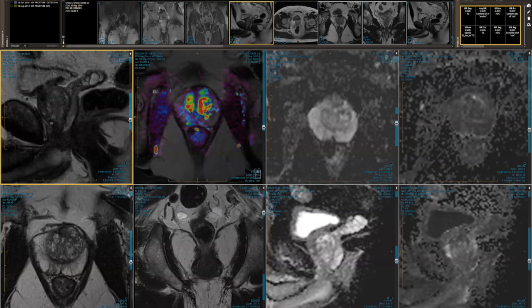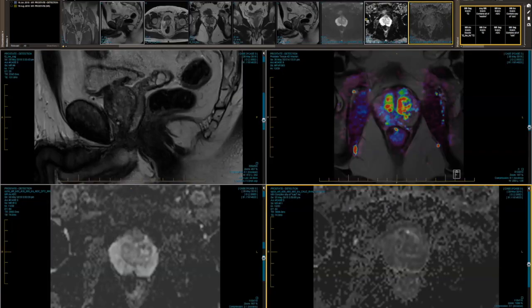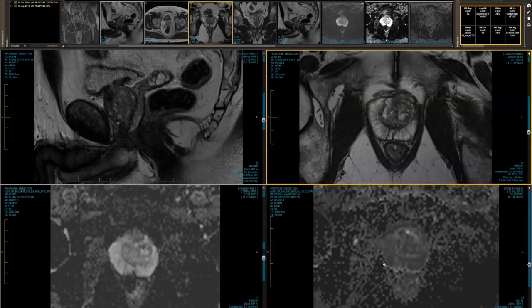Again, so this is the study. It's a prostate volume of 30 cc, not much in the transition zone. So if I link these ones, it just takes me a sec, sorry.